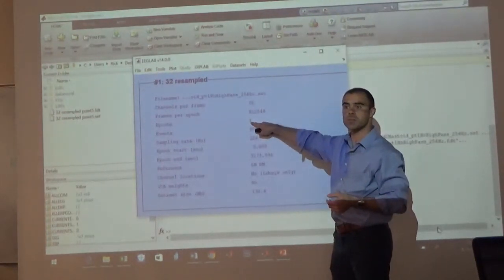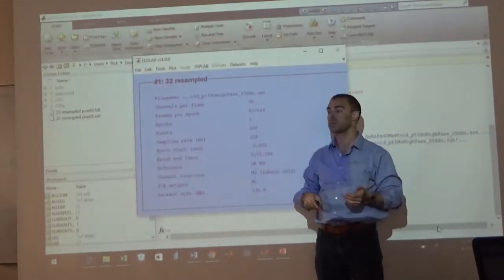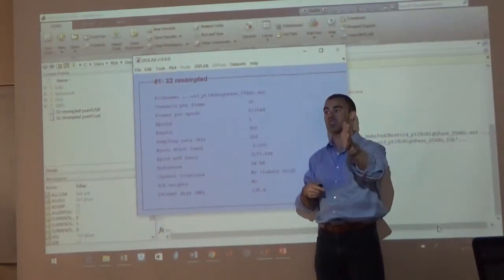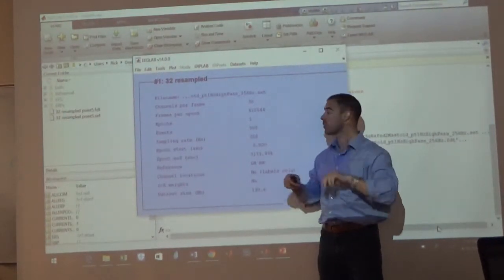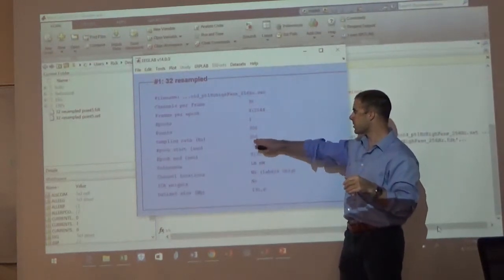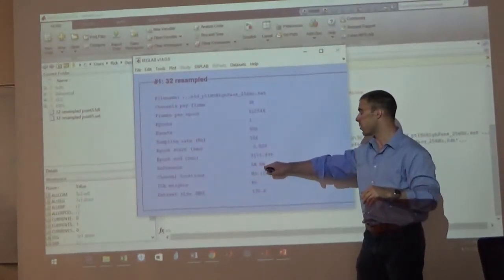We have one long epoch. You guys remember what an epoch is? What this tells us is that there's one long EEG recording. It's not sliced and diced yet into different ERPs. So you have one epoch of 900 events, because we had 300 trials when something came on the screen and somebody made an item memory judgment and a source memory judgment. So that's 900 things in terms of codes that were sent into the data as events. It tells us our sampling rate is 256 hertz, and that our reference electrodes are the left mastoid and the right mastoid.